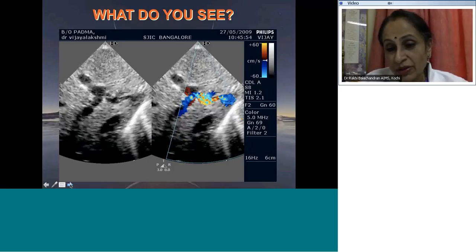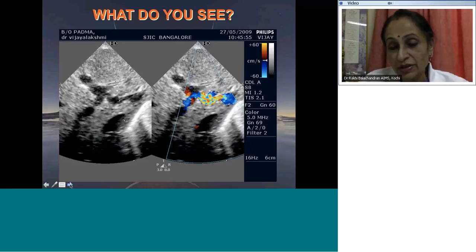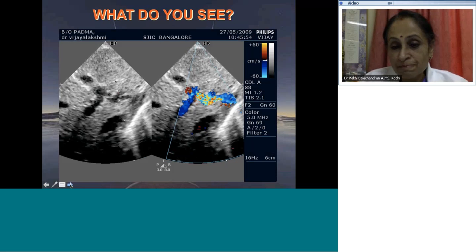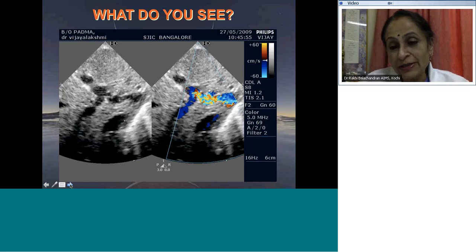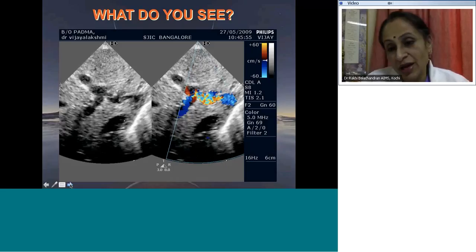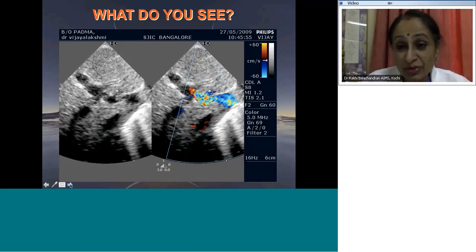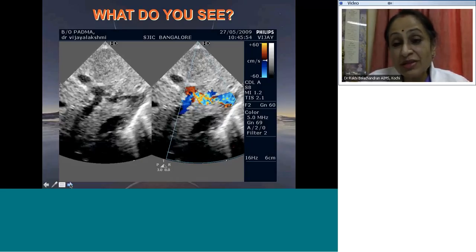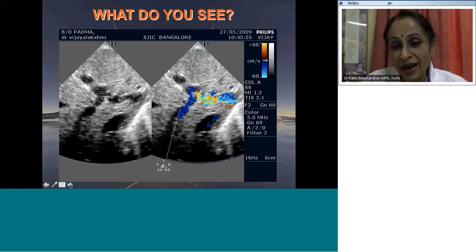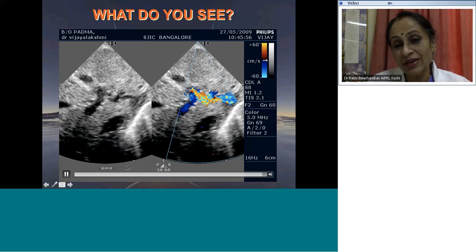What reversal? Nitin, what reversal are you talking about? Flow reversal in IVC, it's not a flow reversal. See, flow reversal occurs when the RA pressure is high or the tricuspid regurgitation is occurring or a tricuspid stenosis is there. But this is a neonate, yeah, correct, obstructed TAPVC, and that too from the infradiaphragmatic type.